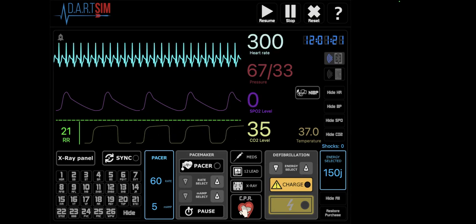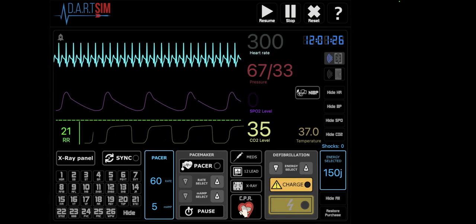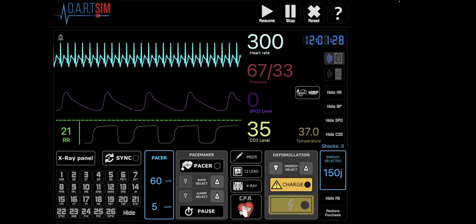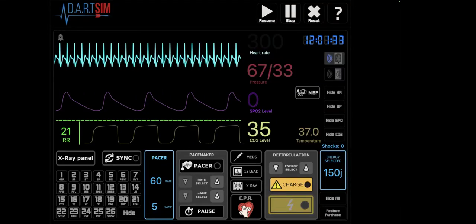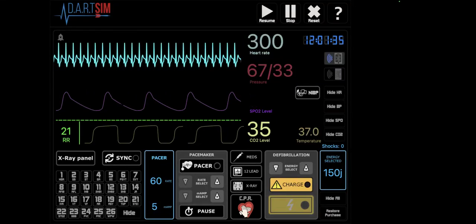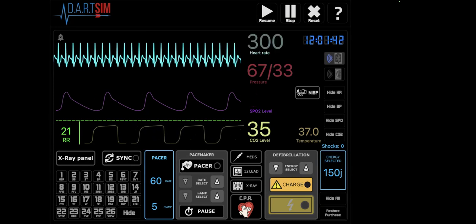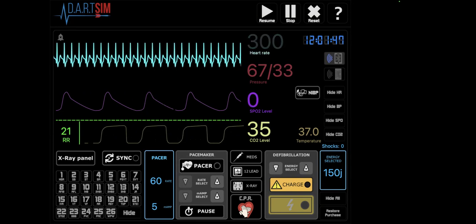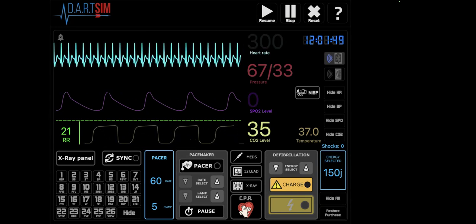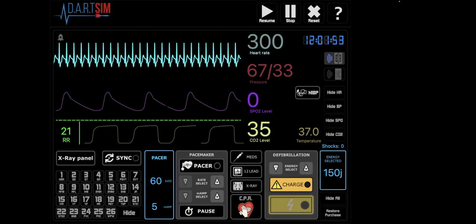This patient is not a candidate for rhythm and rate altering medications because he is considered unstable. And if you think about the tachycardia algorithm, the management of unstable tachycardia, whether the QRS is skinny in this example, or whether the QRS is wide, and one that we'll look at shortly, synchronized cardioversion is indicated.